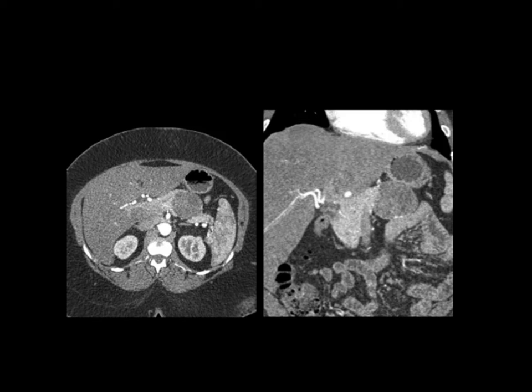The images are slightly noisy because the patient is markedly obese, but location, you might think of an MCN, a mucinous cystic neoplasm, perfect location, classically in females, typically in their 40s and 50s. Solid pseudopapillary (SPEN) tumor, typically it's female, but it's younger, in the teens and 20s, but it can be older, so it's a possibility. Serous cystadenoma, the lesion is well defined. Perhaps it's somewhat cystic, that's a thought.